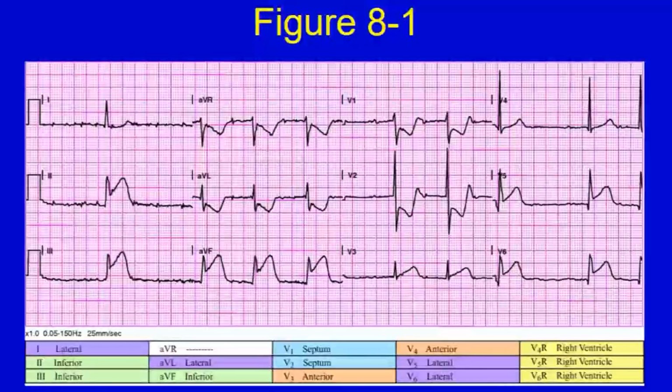So which leads have ST elevation in them? So definitely 2, 3, AVF. What about V5, V6?